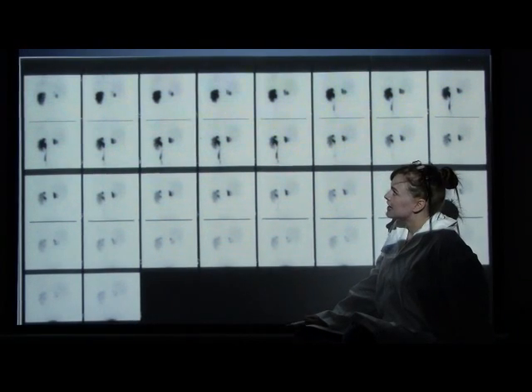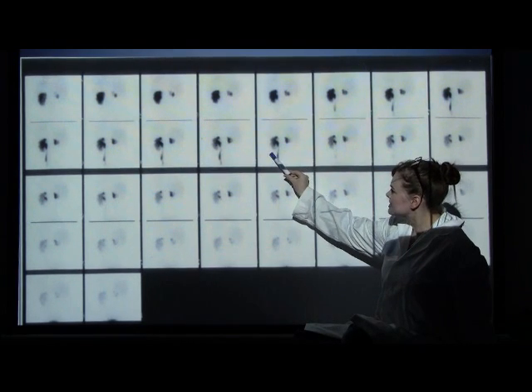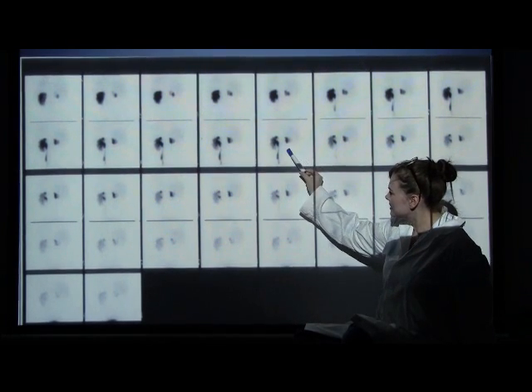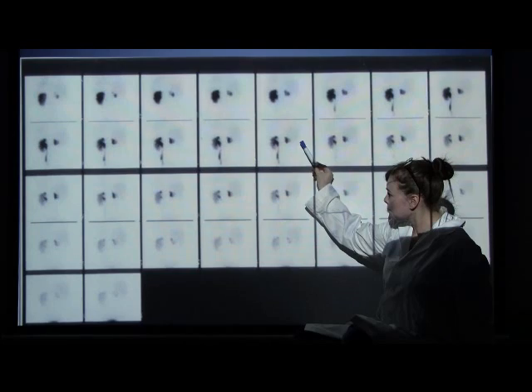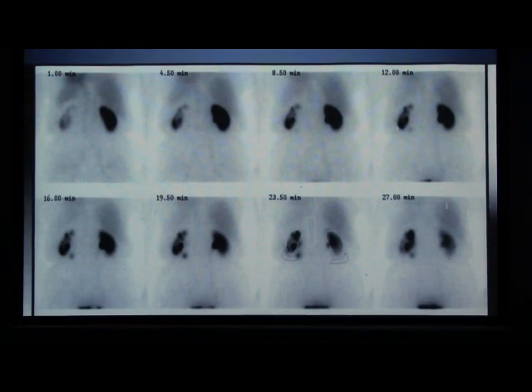In this renal scan of the functional phase, we can see that the left kidney is enlarged while the right kidney is diminished. In this renal scan of the immediate phase, we can see that the right kidney has a case of hydronephrosis.